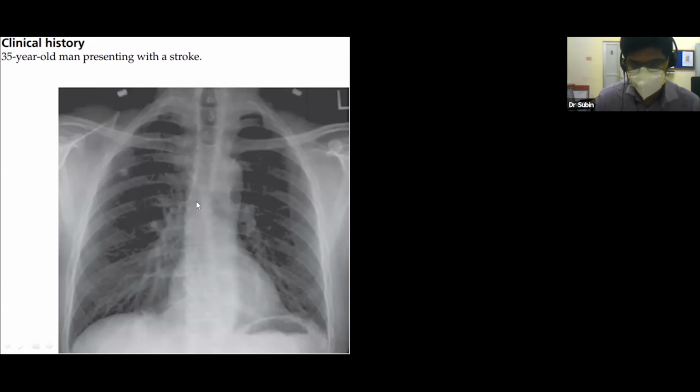Again, trachea. Okay, left lobe. No, not the left lobe. Left lobe of the lung, you mean, right? Yeah. Nothing in the left lobe. Which side? Left lower, upper? It is not at all on the left lobe. Descending aorta is normal. Yes, it's normal. Descending aorta is normal. Anything else?